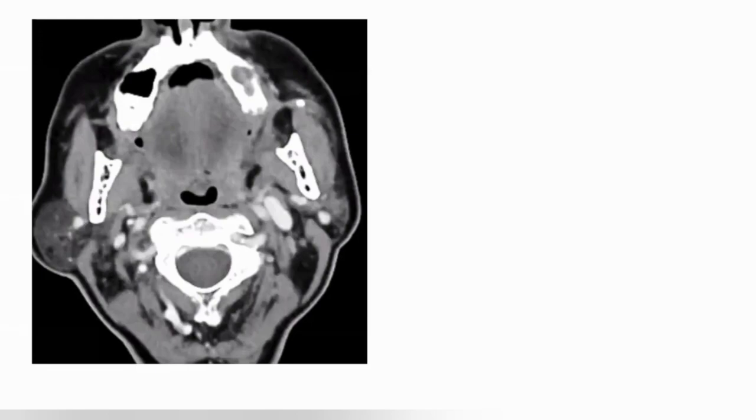Vein is fine. Vein can be enlarged. Anything else you can see that can cause chronic inflammation of the parotid gland? Sir, a calcific density is appreciated. Yes, it could be a stone in the parotid duct causing the atrophy of the gland.